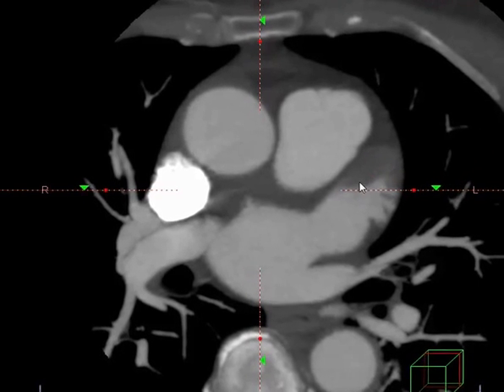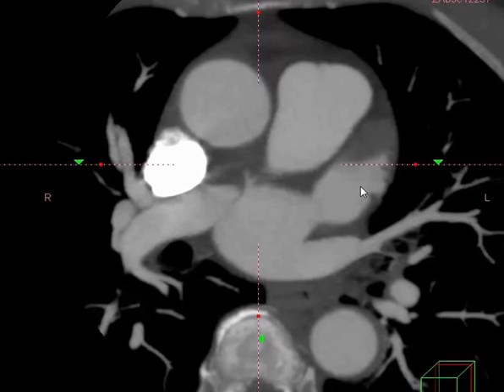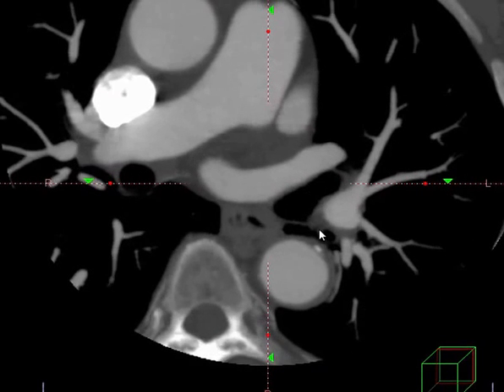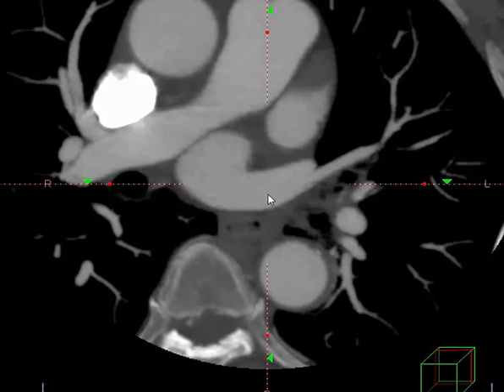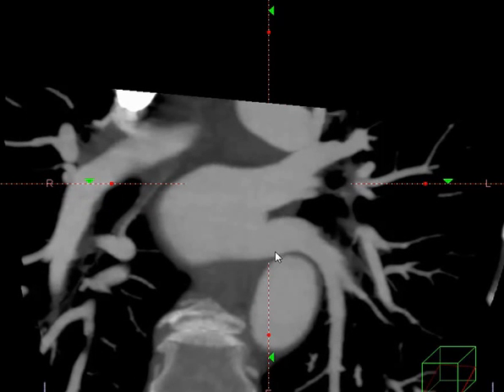Now let's delete this and start looking at the other characteristics. So we want to identify several things. First of all, we want to determine how many pulmonary veins there are. Right caudad to the left atrial appendage is the left anterior superior pulmonary vein, which I'm demonstrating right here. If we look at this, we can actually rotate down 90 degrees. That is, we're rotating in this direction, and almost always you'll get to see also the left posterior inferior pulmonary vein.